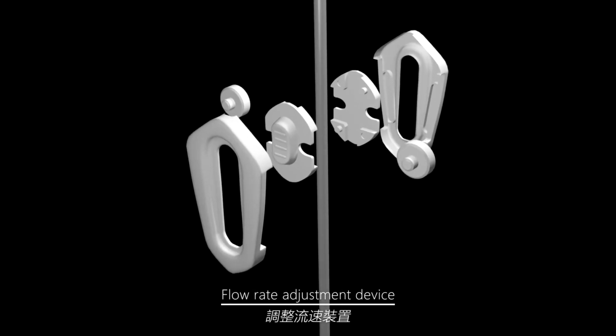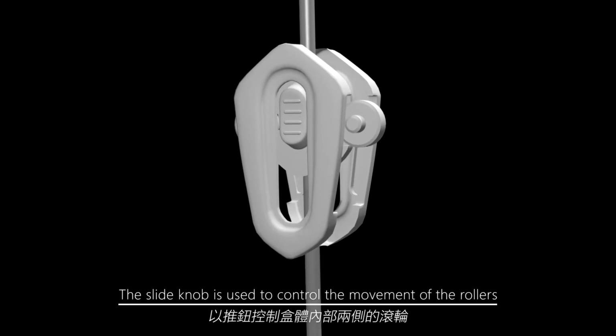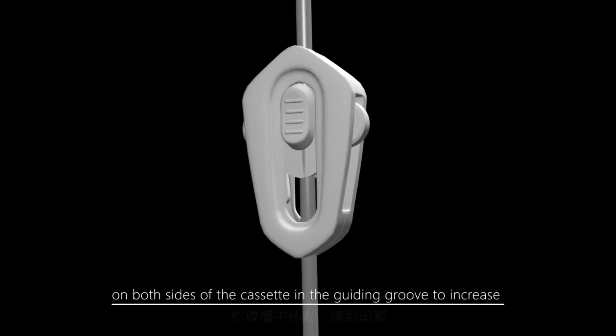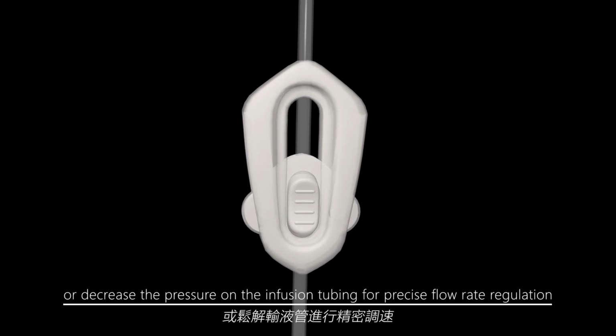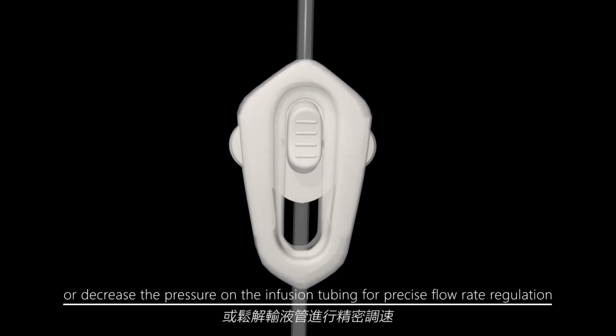Flow rate adjustment device. The slide knob is used to control the movement of the rollers on both sides of the cassette in the guiding groove to increase or decrease the pressure on the infusion tubing for precise flow rate regulation.